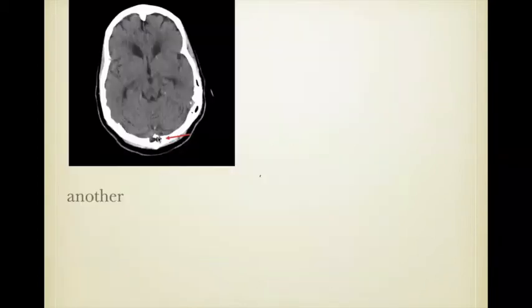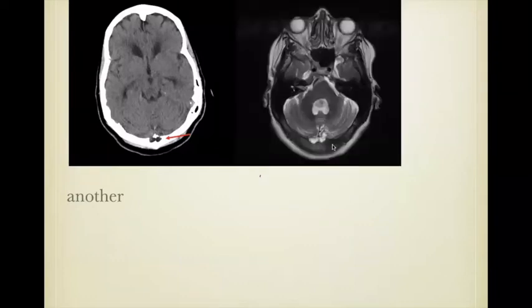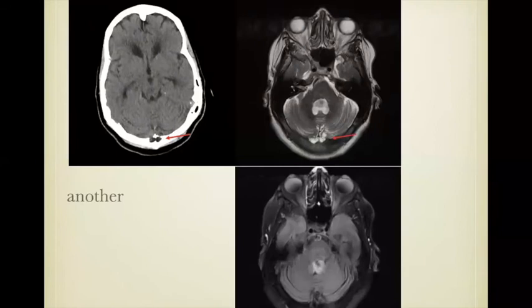Here's another one. This one's closer to the midline. You see these defects. This is very commonly seen in the occipital bones. These are often called venous lakes, but you'll notice on the MR scan, these actually have CSF attenuation. And here it is on the FLAIR scan. You see it suppresses completely, which again, because it's near a sinus, could be thought to be an intradiploic meningocele or an arachnoid granulation. In either event, this is a normal finding.